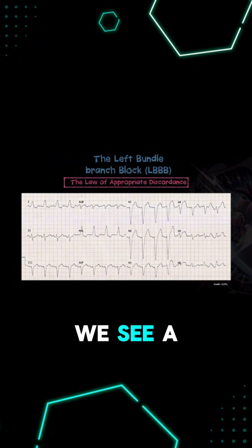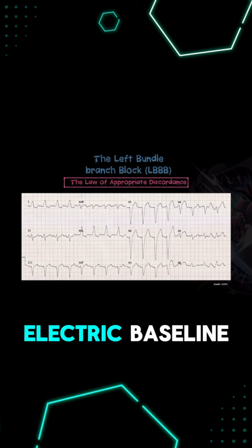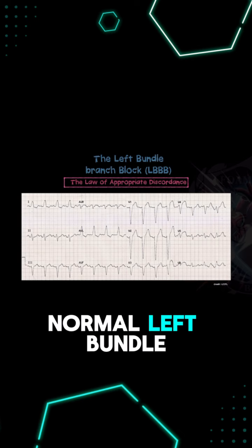In aVR, we see a negative deflecting QRS and a J point that goes back to the isoelectric baseline. So this is all part of a normal left bundle branch block.